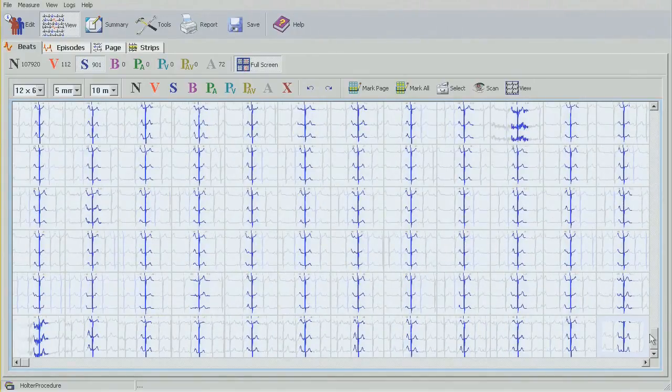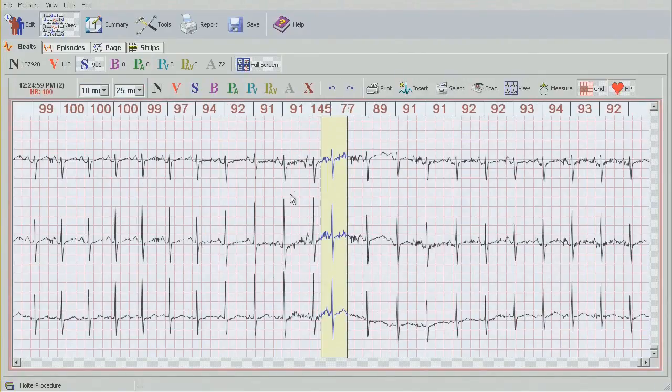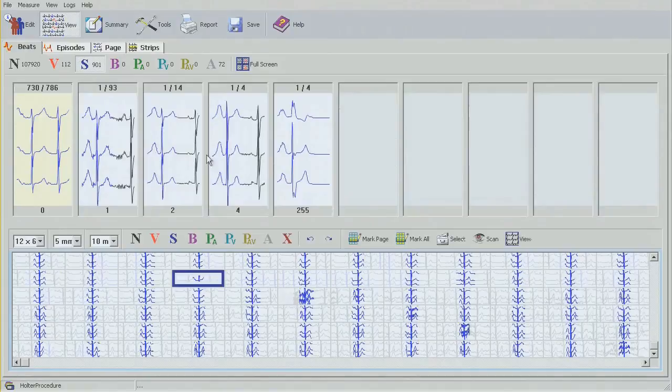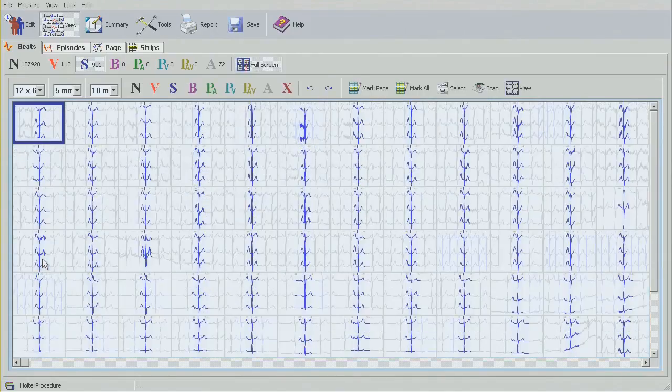So again, just double check the very bottom of the page, double click on the last one, scroll it down, and double click again, so all these are correct. Again, tagging any of these beats using the Z key to get out of there, moving on to the next, bin number 2. And again, all these seem to be fine.